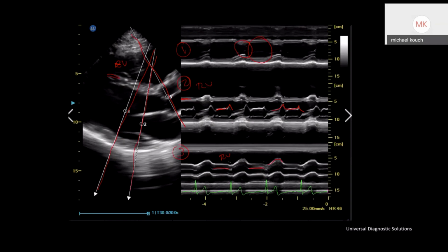However, in systole, what we start to see in this image is that those leaflets start to separate. And now we have opening through the valve through which blood flow could travel. And then at the end of systole, it comes back together in coaptation, all right? So that's our normal image of our aortic valve. Again, coaptation during diastole, valve starts to open and we see two separate leaflets open, okay? At the end of systole, they come back together and they form what looks like one structure again. And that's just the valve stuck together, okay?